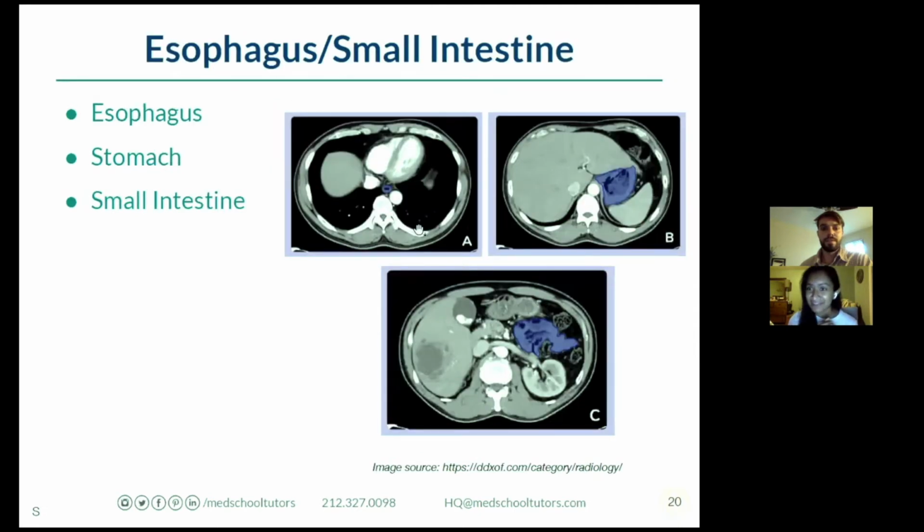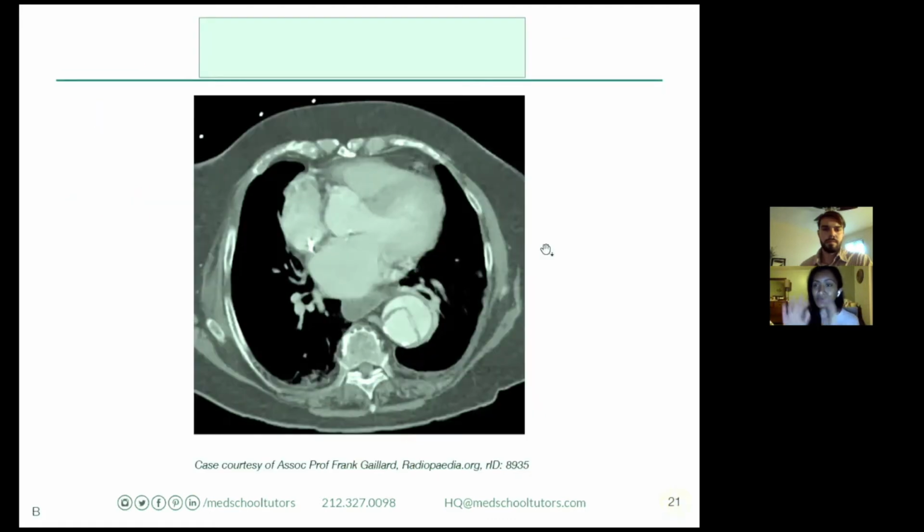And then the other half of the GI tract, I know it's a lot, guys, bear with me. The esophagus, right? So coming from the top now, we have the esophagus here, turns into the stomach, turns into the small intestine. And small intestinal pathology, they won't really test you too much on because it's impossible to track small bowel in the abdomen. But just to be aware of what you're looking at, all of this sort of stuff is just loops of bowel. So you know. Okay, and with that whirlwind, now we're going to take some cases.